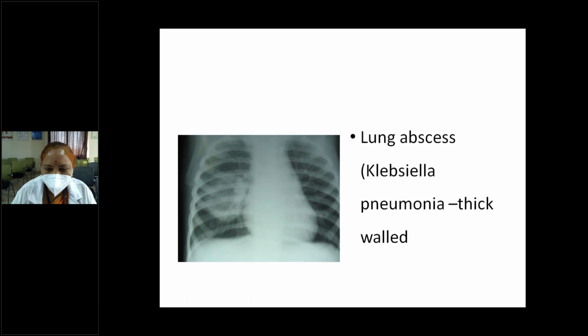Okay. A thin walled cavity may be due to tuberculosis, a cavitatory lesion, but a thick wall with non-homogeneous opacity is most probably a lung abscess. What are the commonest causes, the commonest organisms, for lung abscess? Pavan. Hydatid disease, ma'am. What? Commonest organisms I asked. Klebsiella, Pseudomonas. Okay, right side lung abscess.